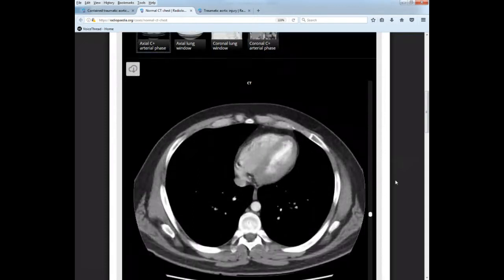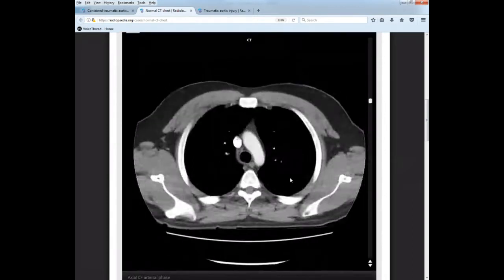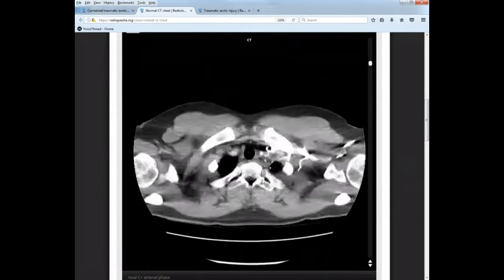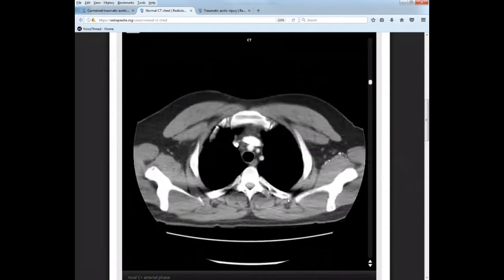Let's go back to our axial. Let's scroll all the way to the top again. So we have our bony thorax. The other thing that I want to point out, which you can see right here is actually a good slice, the posterior attachments of the ribs. So we talked about the anterior attachment at the costal cartilage.